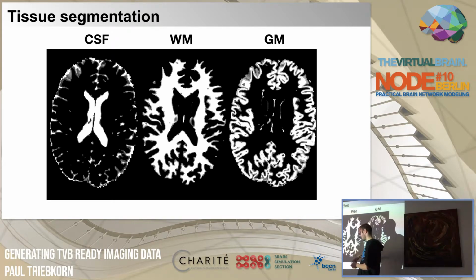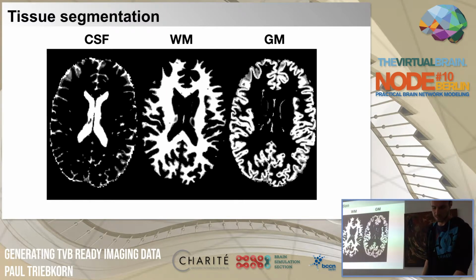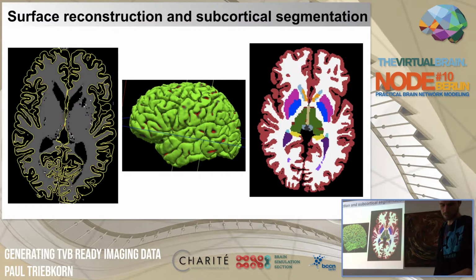So the streamline algorithm is just stepping through the brain, right? And if by chance it ends up here in the ventricles, then this is an implausible result and should get deleted. But more on this later. So white matter, CSF, and gray matter. This, well, here not including, should include also the subcortical gray matter here. This is used to build the regions of our brain network model.